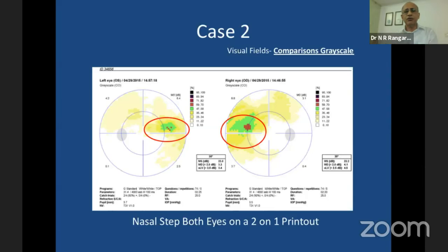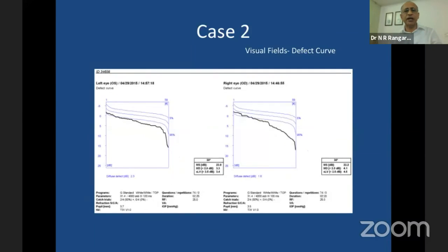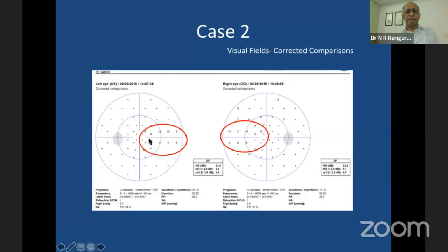So when we do a visual field, we are looking at the topography of the defect, and it's not about this many points, this much percentage. We look at what the topography of the defect is. Is that correlating with the structural defect? That's what we're looking at. And this is, of course, the Bebie curve, which tells you that the diffuse defect is here, and you have the focal defects, which are the slope, which is the SLV, which is the same as PSD.